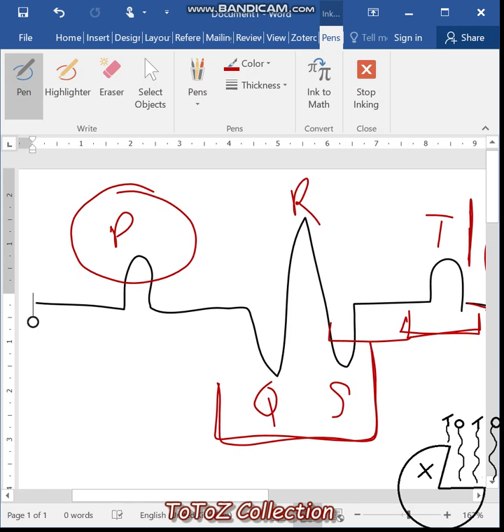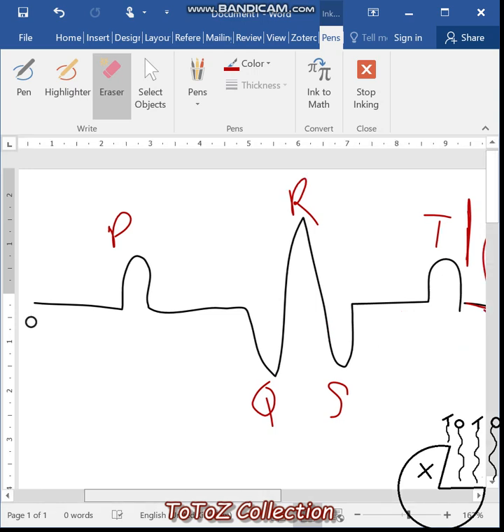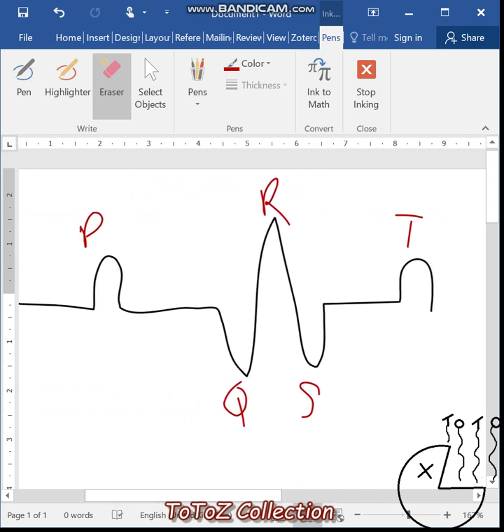So here I wanted us to look at the different abnormalities, the different heart conditions that a person would have, and how your ECG will look upon a person having that specific condition. So we need to be familiar with the segments and the intervals of the PQRST complex.